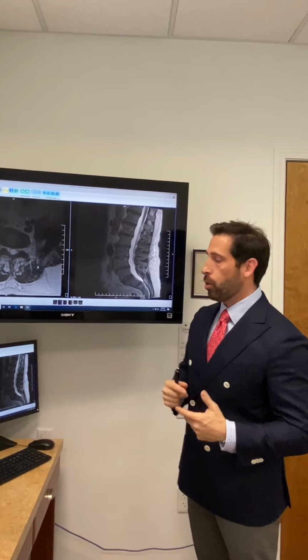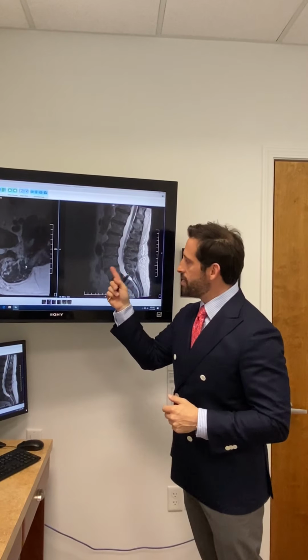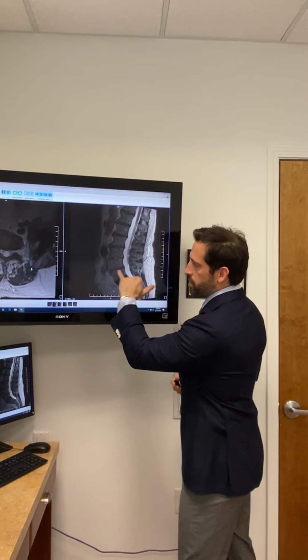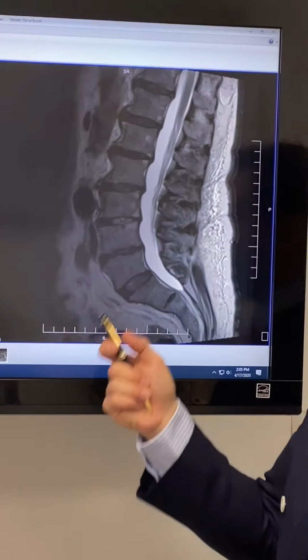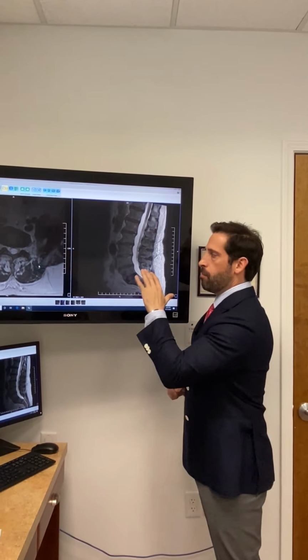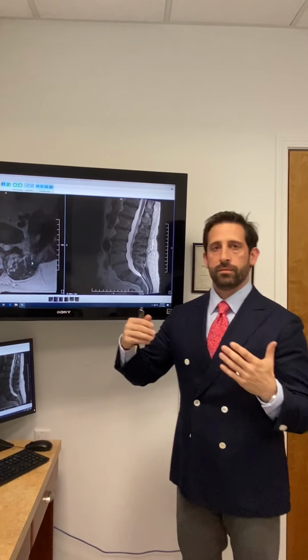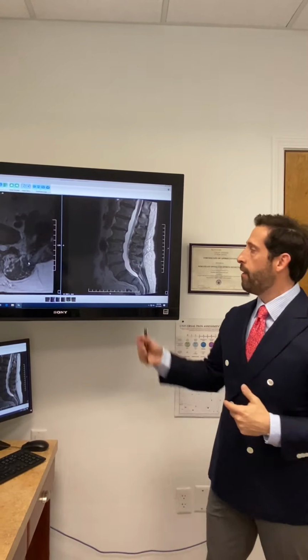This one here is also dark gray or a charcoal color, or also black. This is significant for degenerative disc disease. Specifically here, if you can see closely, if my assistant can zoom there well enough, you'll see that that space is a lot thinner than the space here. This is moderate to severe disc decay. Now, what this can do for any individual, any adult mainly, is cause tremendous amounts of lower back pain.